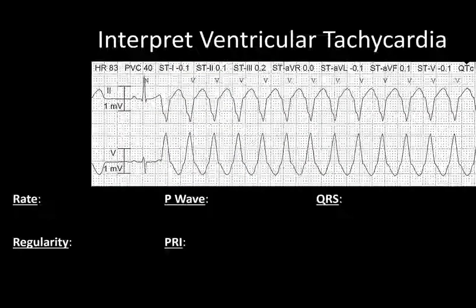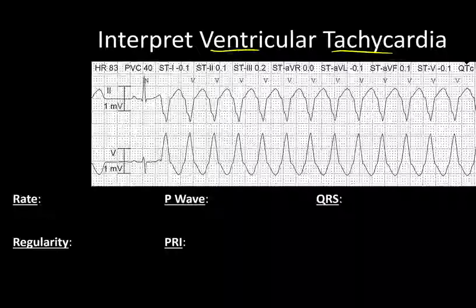Here is a classic example of ventricular tachycardia. You can see at the start here where it begins a sinus rhythm, and then the patient changes what they're doing. The things I want you to focus on here is that each of these, so this is where it starts and that's where it ends. So that's a single beat through here. This section here to here is the QRS. This up here is the T wave.